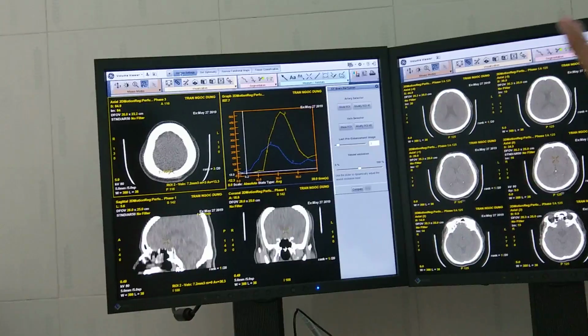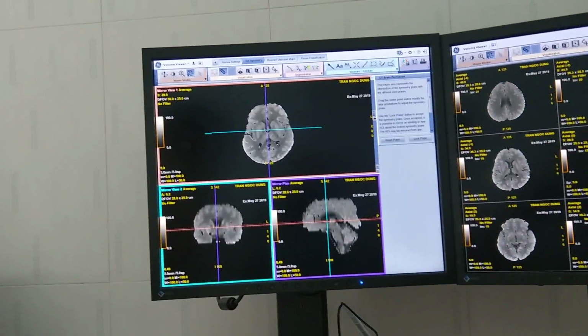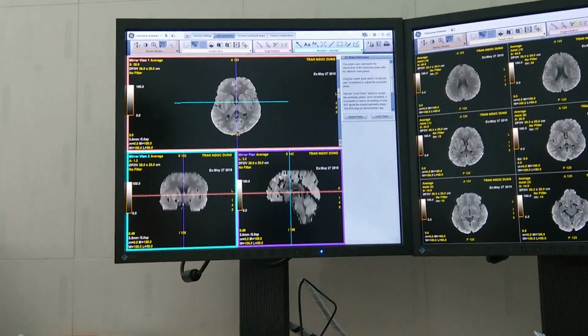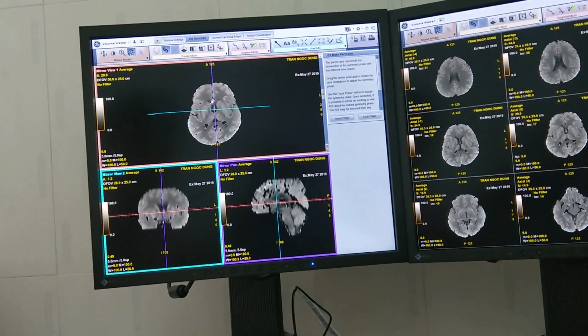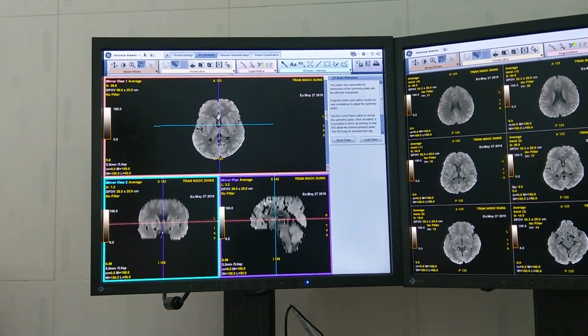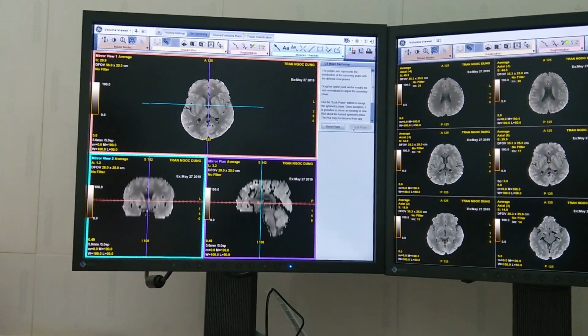Then you go to the next step, which is set symmetry. Define the video and adjust. Only in axial. Don't do in coronal and sagittal. Only do in axial. Không làm bên hai nữa. Only do here.